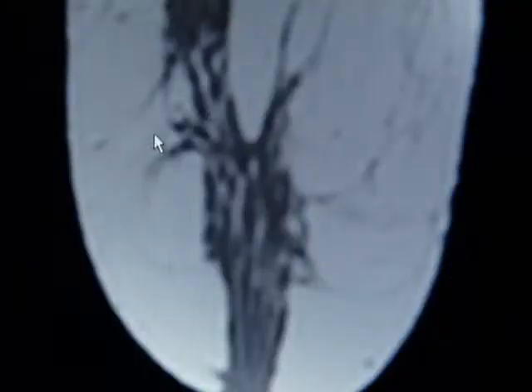Cross-referencing of this smoothly enhancing, somewhat reniform shaped focus in the right breast with the T1 acquisition demonstrates again a reniform configuration or horseshoe shaped nodule with, on this T1 sequence, a fatty hilum. This is just a normal intramammary lymph node. I would then proceed with my dictation.